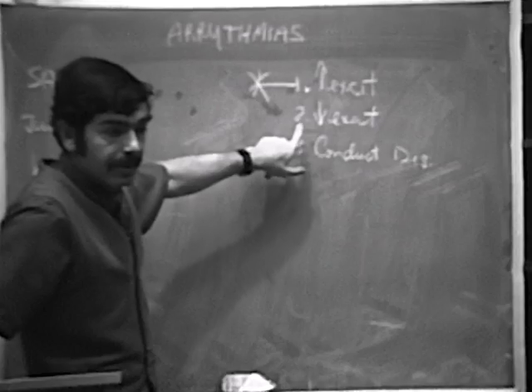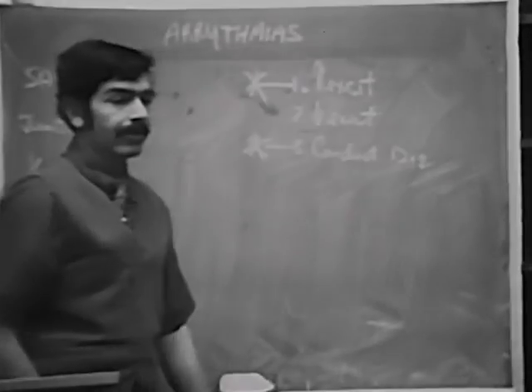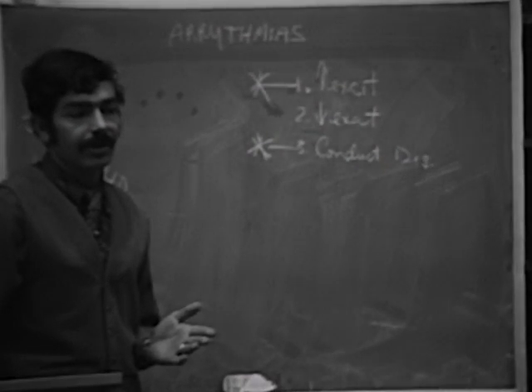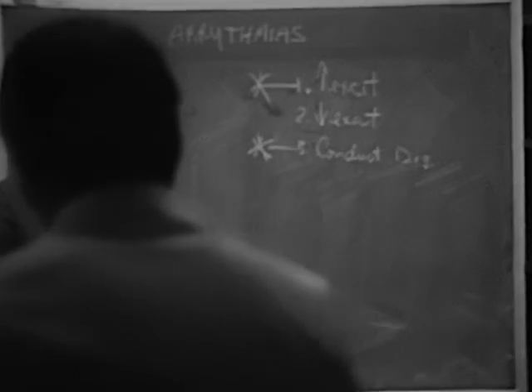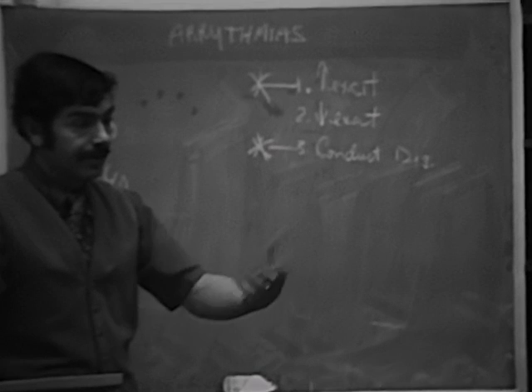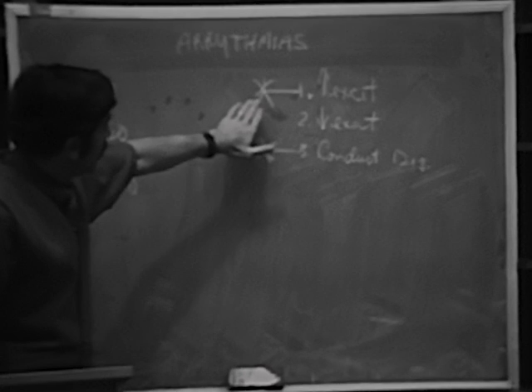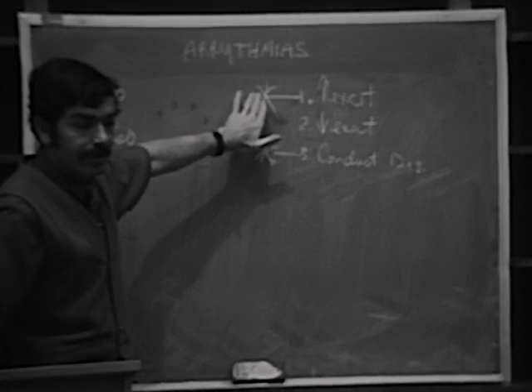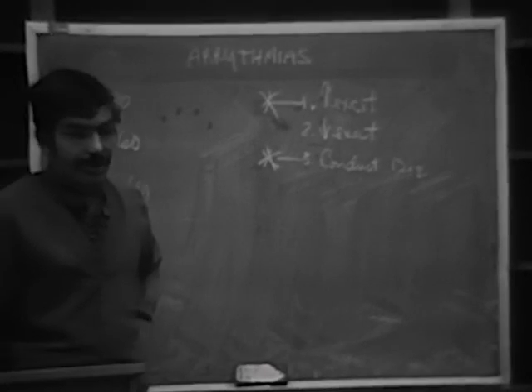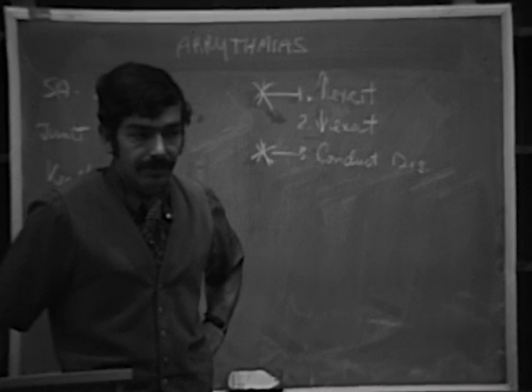And the other thing that digitalis does is it produces conduction disturbances, right? And we very frequently see examples of AV block in patients taking digitalis, right? First degree block, and then if they start to get toxic, well, actually first degree block may be considered a sign of toxicity, and then higher degrees of block all the way right through to complete heart block, right? So this is what digitalis does, really. It increases the irritability of myocardial tissue, and it decreases the conduction through the AV node. So you get heart block, produces conduction disturbances through the AV node, right?